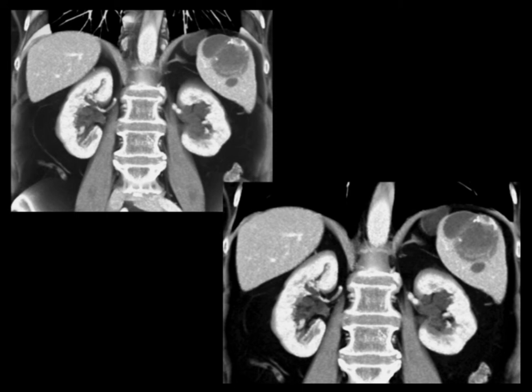Well, I guess you can do MR. That probably won't be certain either. You can do nuke studies. That's not going to help much. Maybe it'll show no activity, so you'll be a little bit less concerned, but I think it's still going to be a challenge.